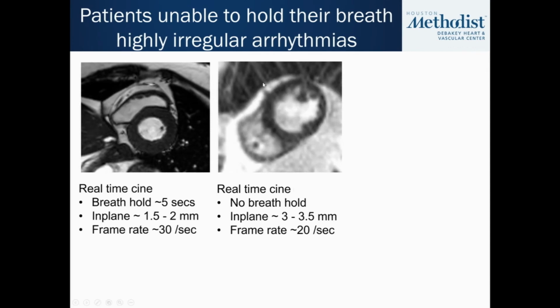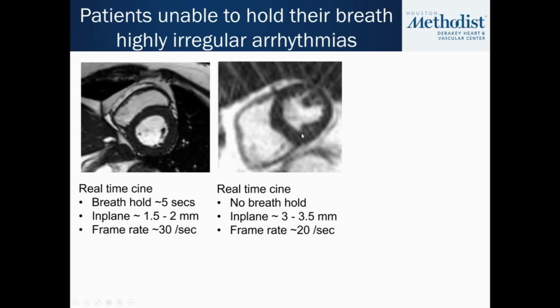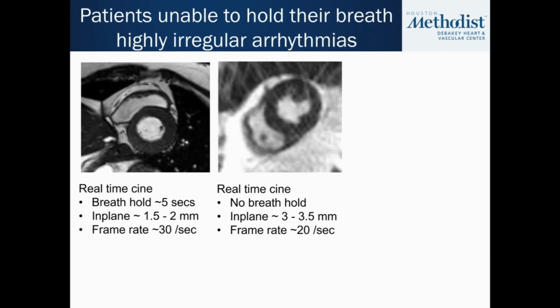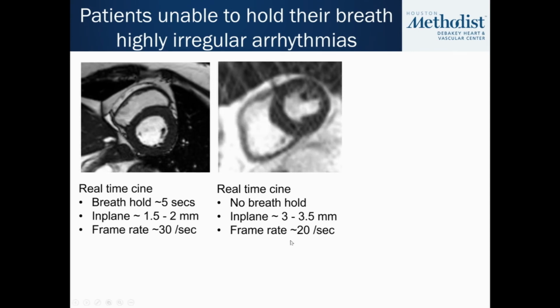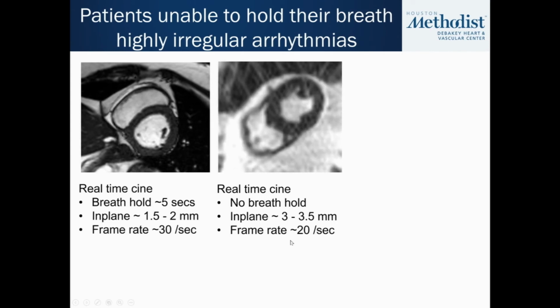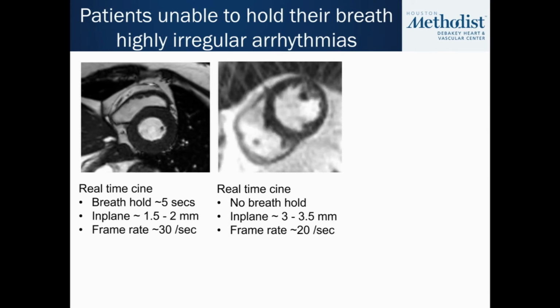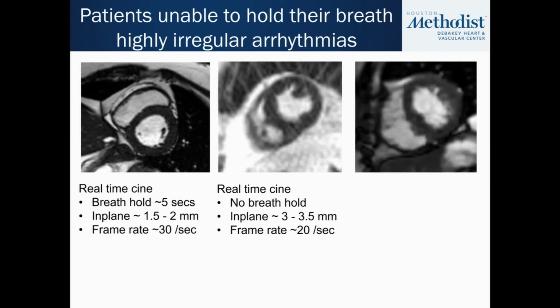And as you can see, there's a sacrifice with the resolution of the image, but this is pretty excellent too, if you ask my opinion. So the resolution will be slightly lower, the frame rate will be slightly lower, but if you want to look at things like ventricular interactions or changes with breathing with ventricular volumes, then these are very useful.